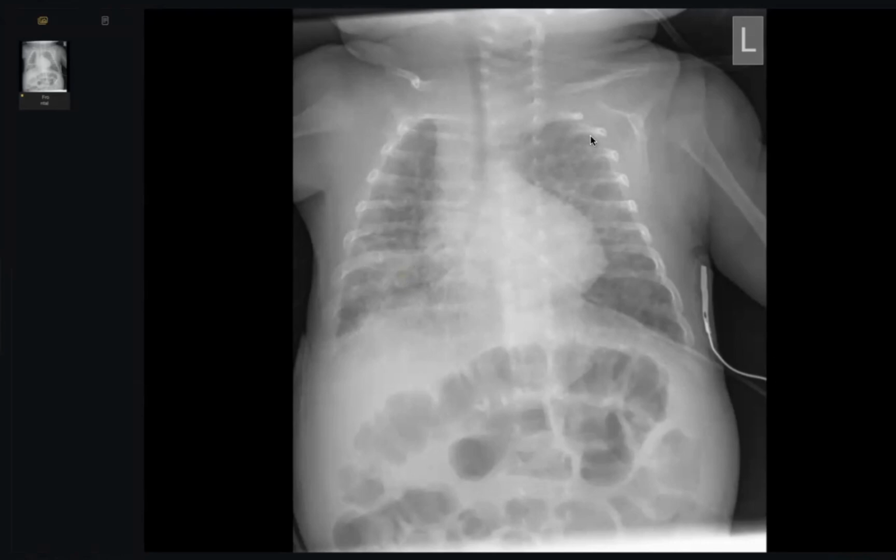What about the lung volumes? Yes, the right lung volume is significantly reduced, with marked atelectatic changes, as well as the very important differential point to differentiate it from interstitial emphysema. Okay, the lung volume is reduced.